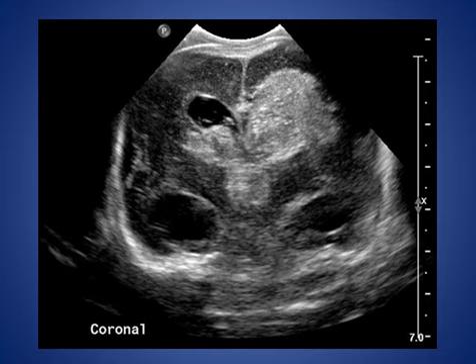Here, in the next case, we have a 3-day-old infant, 25 weeks. As we see here, cranial ultrasound of the patient shows intraventricular hemorrhage filling the left ventricle and the third ventricle, and also intraparenchymal hemorrhage on the right side.